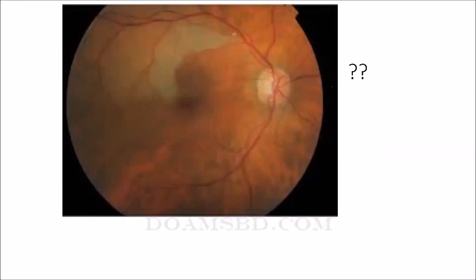What is this? Is there any vascular occlusion? Is there any ischemia in the retina? Yes, sir, this is the white area. There is some area of retina under less circulation. So there's some vessels actually not occluded from the very proximal part, maybe in the distal part, and there is a white spot. It seems this is the thrombus impacted here, and the distal part is occluded.